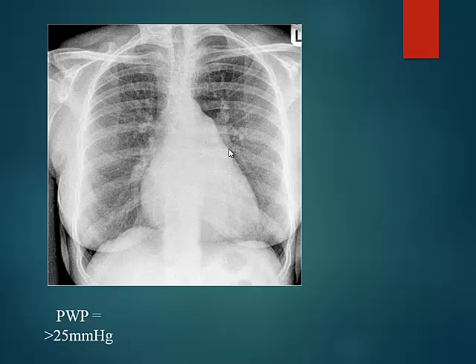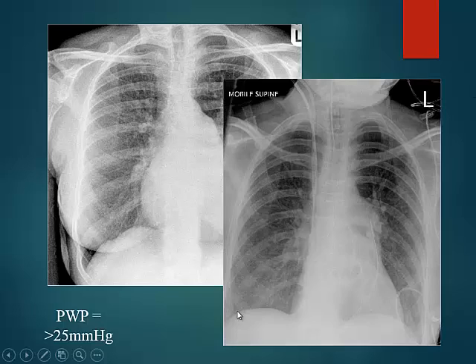This can be large in young females normally also, but the important thing I think is this is quite large, I must say, and the heart size is increased. So this patient, same patient's X-ray, what do you see there? You can see there's a catheter going in, and it goes like this and goes into the right pulmonary artery. This is a Swan-Ganz catheter.